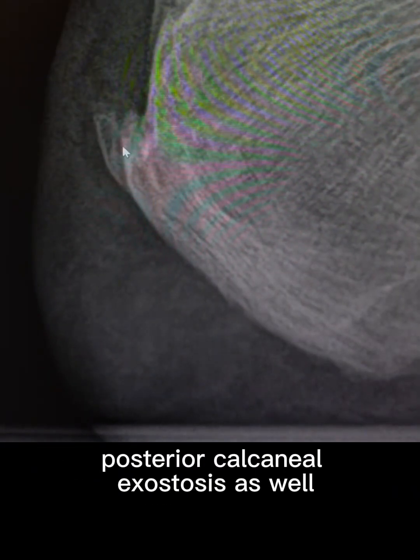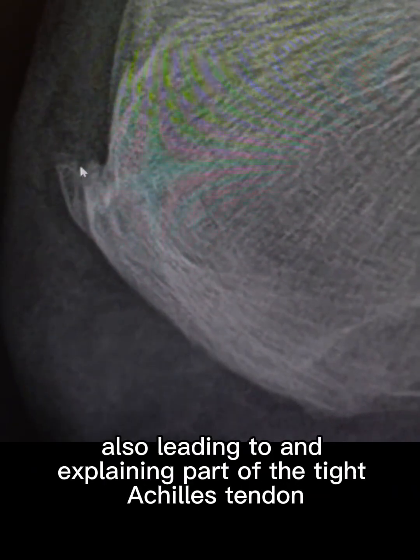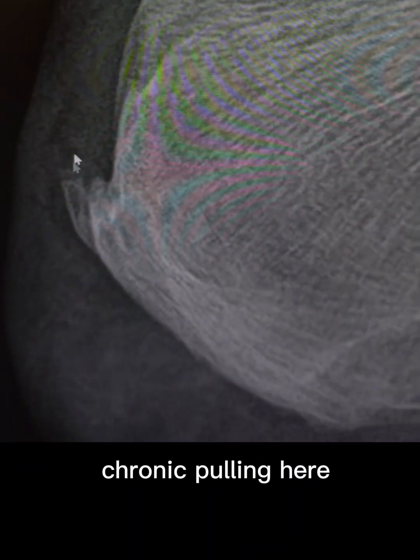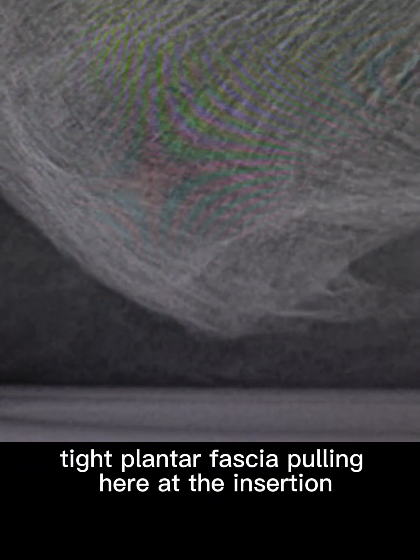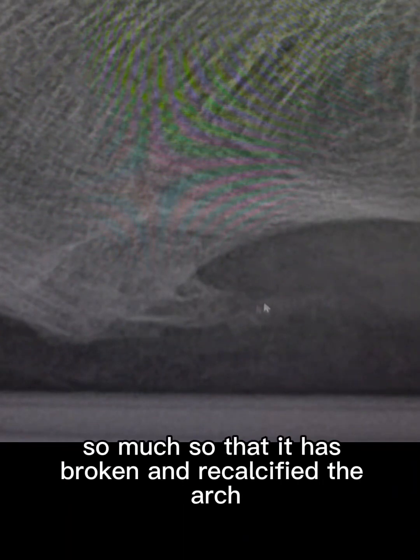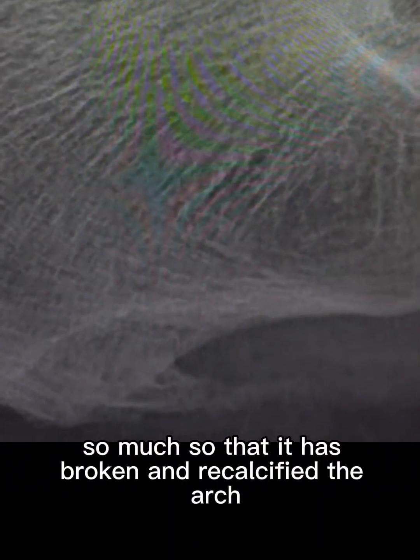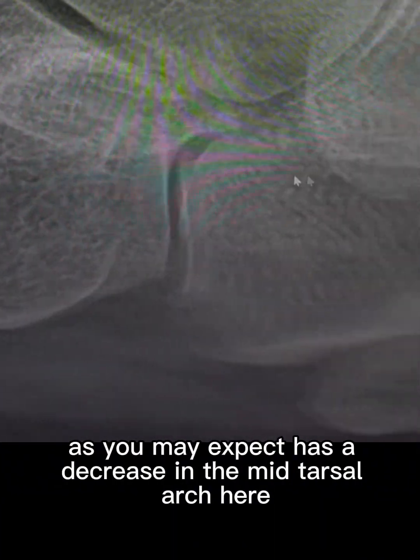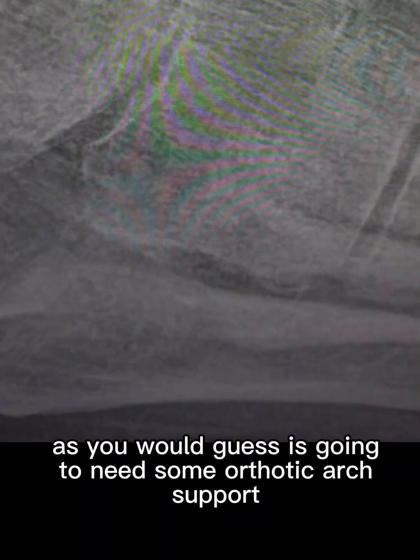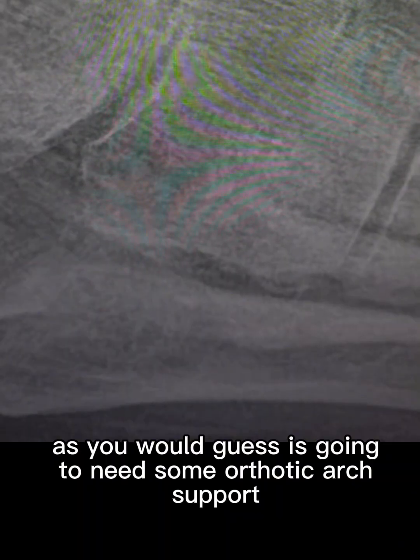Posterior calcaneal exostosis as well, also leading to and explaining part of the tight Achilles tendon, chronic pulling here, tight plantar fascia pulling here at the insertion, so much so that it has broken and recalcified. The arch, as you may expect, has a decrease in the mid-tarsal arch here, also adding to the fact that, as you would guess, she is going to need some orthotic arch support.